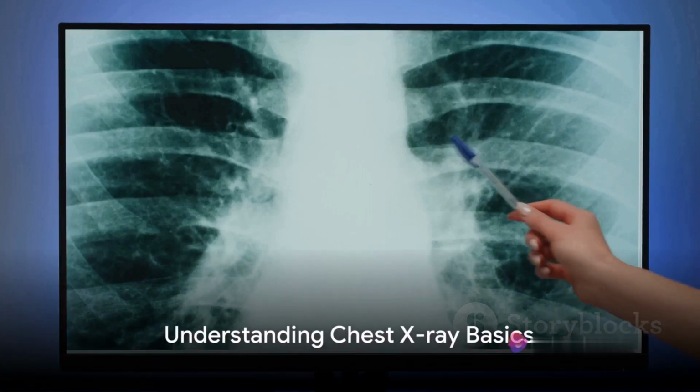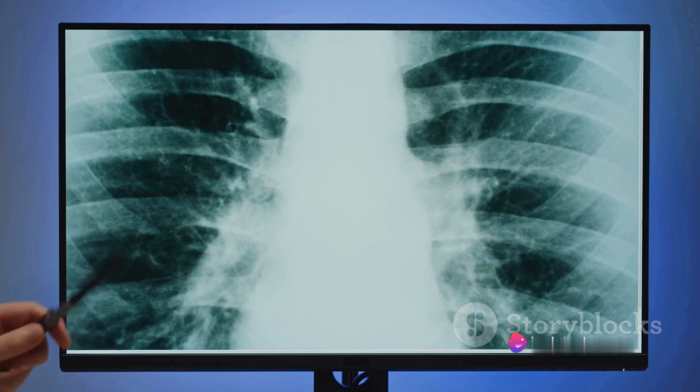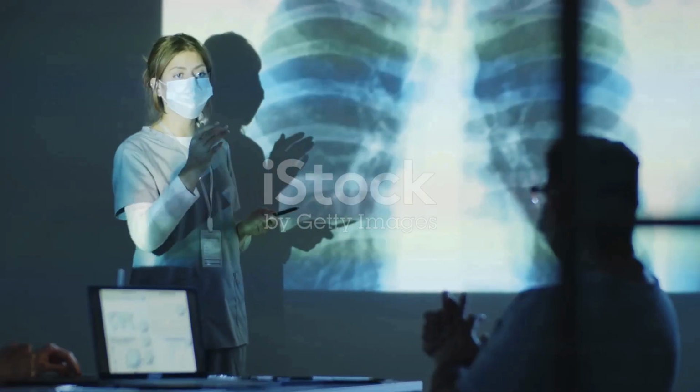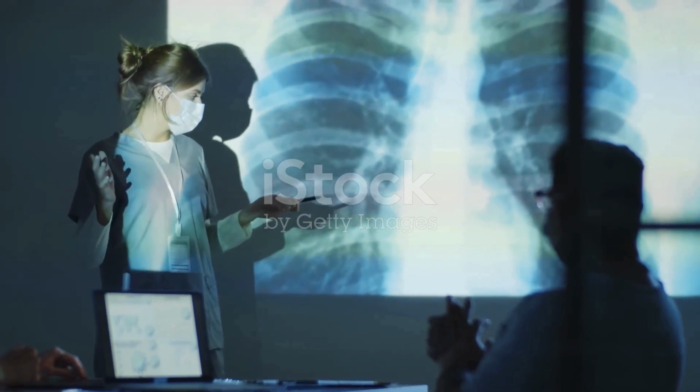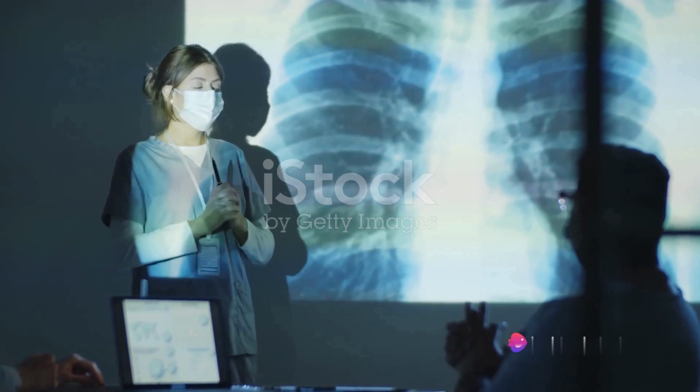Ever wondered why X-rays show areas of opacity and lucency? Let's dive right into it. Radiology is a crucial part of medical practice, and chest X-rays are among the most common diagnostic tools we use. Understanding the basics is important, regardless of your specialty.